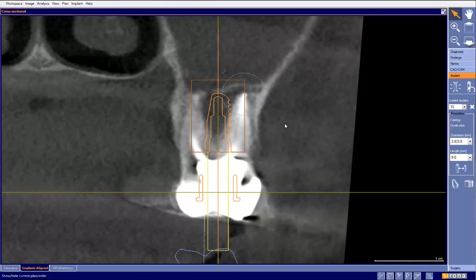So what I would like to do again is go ahead and draw my bone, just like so. And so my first thing here is, actually this is probably more like the bone right there. So my first note in this particular plan is, by using this outline for the bone where the bone really is, the implant is not planned deep enough.